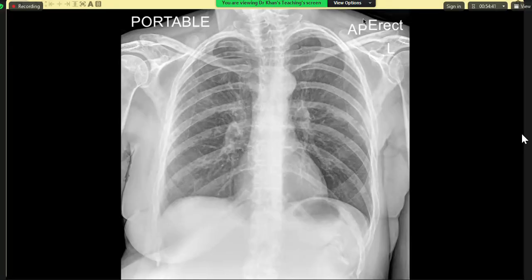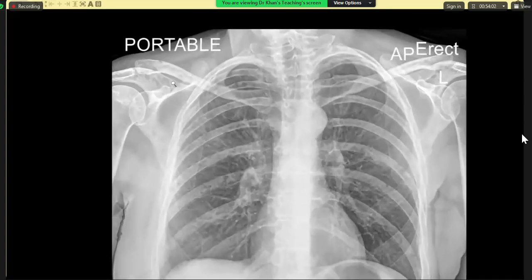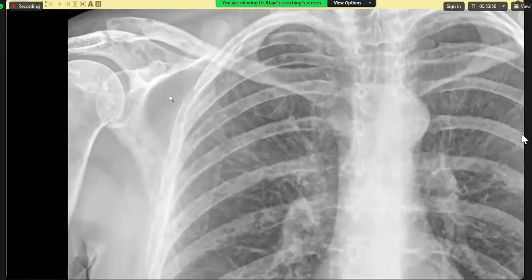Okay. How can you confirm that? By CT, if I would, madam, go for. I think you are reporting this case. How will you confirm it? What will be your reflex? Just X-ray. From X-ray, okay. And this is what this exam is about. Simply ask for a magnified view, magnify it, change densities. Simple as that. And this is what you have to develop, your reflexes. Keep asking simple things. And this is how, when you report in your day-to-day, this is what you are going to do. Now, confirm.